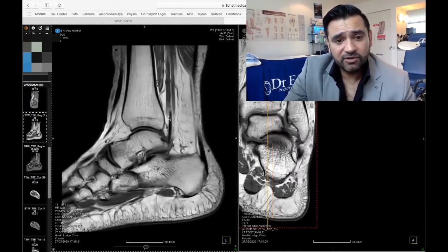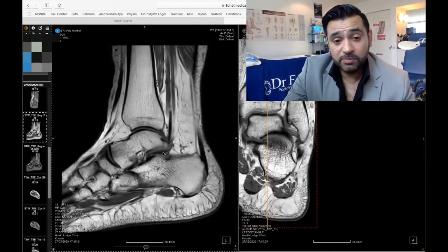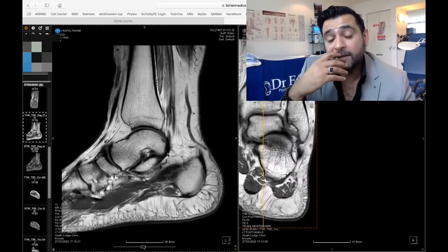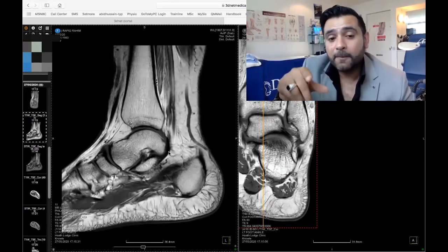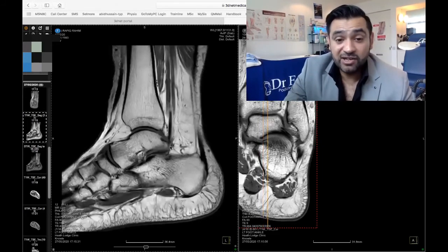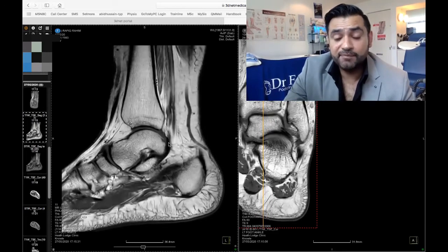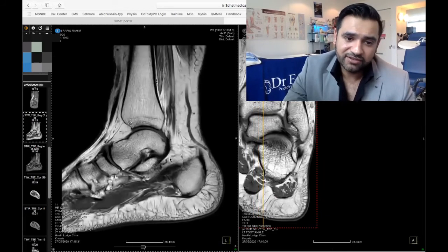This is flexor hallucis longus. And look where, if you had an accessory bone, it would probably be here. It's your os trigonum. And it comes around and goes in a process in the back of the talus where it sits. It's called a Steida's process. So if you have posterior ankle impingement, it's because of two reasons. Either you've got an os trigonum, or you've got an enlarged Steida's process, and it comes around and it shoots into that direction. That's awesome, isn't it?